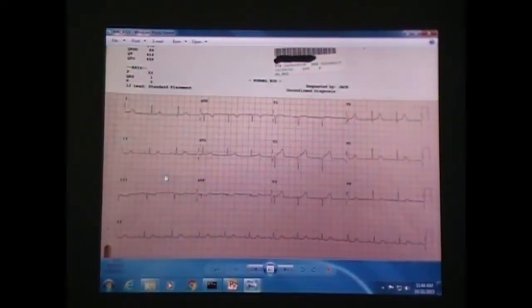Pretty good. Good. All right. So general overall impression is it's normal for the rate. I've got a P with every QRS. My QRS is narrow, but I've got a downward deflection in V1, and it looks like 2 boxes. But then what's popping out to me is I see V2, I've got my J point right here. So I got ST elevation in V2. Don't really have anything in V3, not really anything V4, V5, V6. And I see a possible little depression over here in 3.